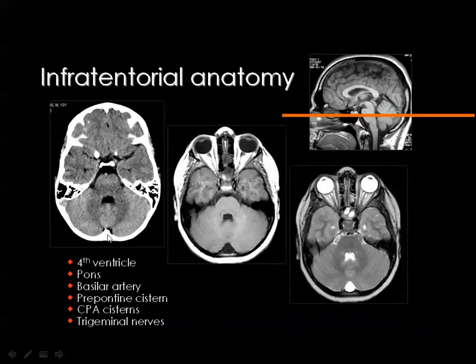And posterior to the cerebellar vermis, you'll see the cisterna magna, one of the largest basal cisterns. Then the junction between the cerebellum and the brainstem, here in the case of the pons, is known as the cerebellopontine junction. And you know that the three parts of the brainstem, the medulla oblongata, the pons, and the midbrain, are connected to the cerebellum through the cerebellar peduncles.